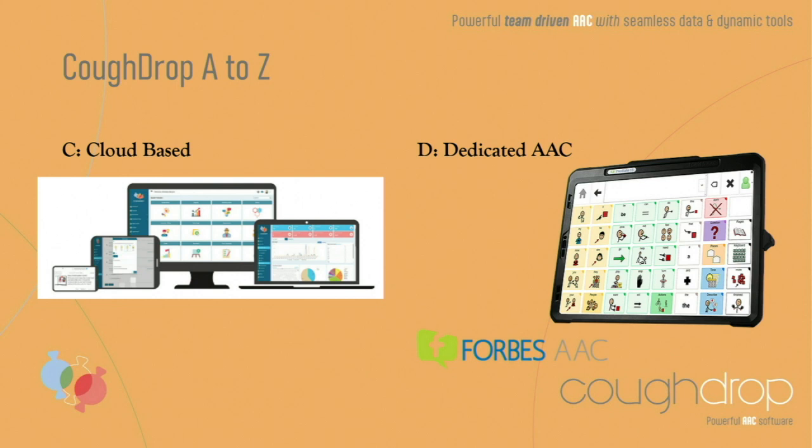So cloud-based. I said device agnostic, right? So it runs anywhere. It lives within the cloud, meaning that all of our content and everything is being constantly uploaded and synced to the cloud, and that's why you have that user experience where it's super seamless from device to device. But a lot of questions come up with this. Do I have to be on Wi-Fi to run CoughDrop?